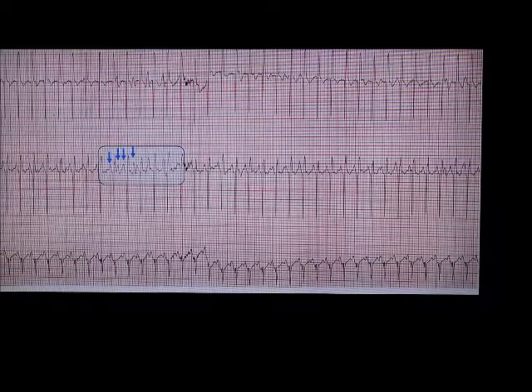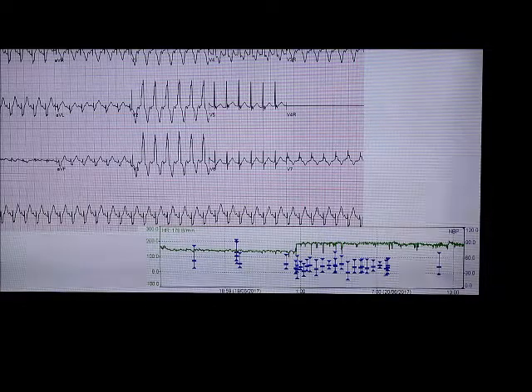And this can happen in atrial tachycardia, because as we said, it has a warm up and cool down, so sometimes you would have a speeding up of the atrial rate and then it will go down, so it becomes 1 to 1. So A more than V, so this is a different morphology. So just say atrial tachycardia, and after that see what kind of atrial tachycardia you have.